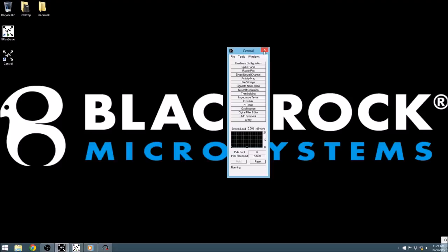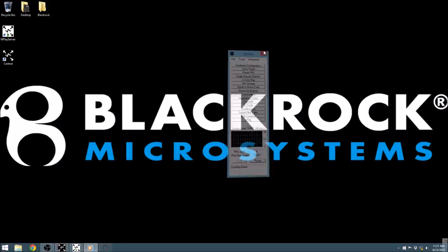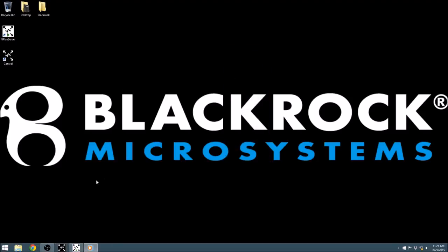That concludes our short tutorial on getting started with Central. Be sure to check out the videos on specific modules to learn more. For more information on Central, you can download the manual on our website at www.blackrockmicro.com.